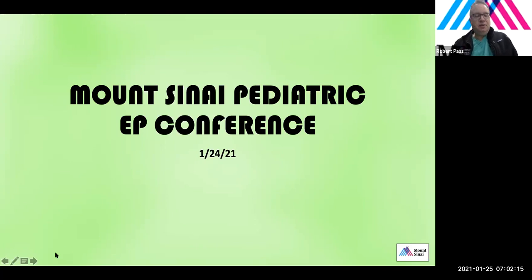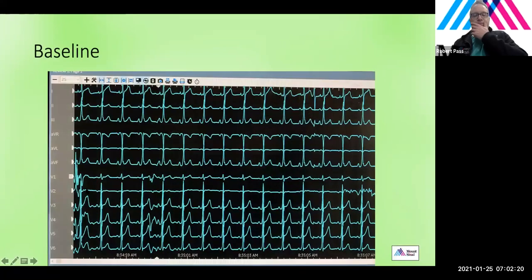Okay. Good morning. So we're going to go over an EP study we did recently. This is the baseline ECG of the patient.